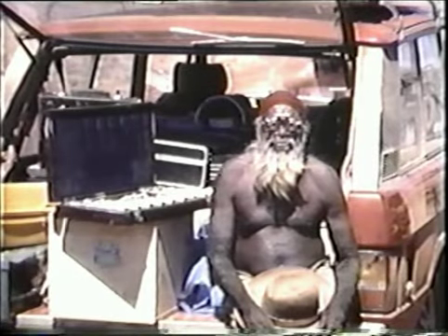For example, if you find yourself in the outback of Australia refracting an Aborigine tribal elder, you will have need of Jackson's special lens. If Edward Jackson were alive today, he would undoubtedly be amazed to see the technological advances in the field of clinical refraction.